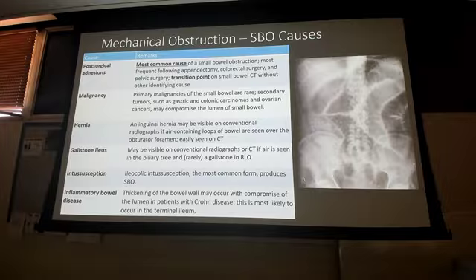So, what a great second or third order question type if I were to give you the image and all the things that scream small bowel obstruction, but then ask you, what was the most common cause of this abnormality? Shake your head all you want. I know, I get it. That's how all your test questions are going to look, unfortunately. It's like, I know you can pick out a small bowel obstruction, but do you know what caused it? Because sometimes all you might get is just that piece of information from the patient.